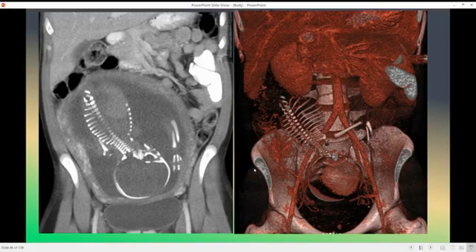This patient with trauma and the CT scan, okay, very good. This is pregnancy with CT scan. This is a CT in a pregnant patient. This patient came for trauma and they did a CT scan and she is pregnant, and this is the baby in her uterus as you see here.